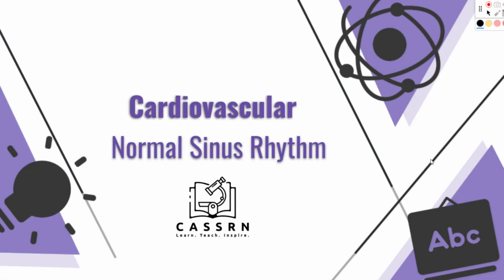Everyone, in this video we're going to go over normal sinus rhythm and the important things that you need to know in order to recognize any kind of dysrhythmias that may come up.